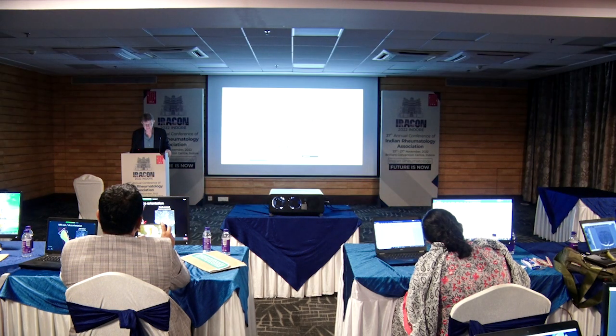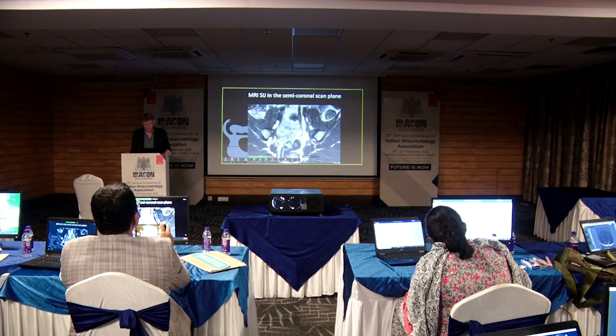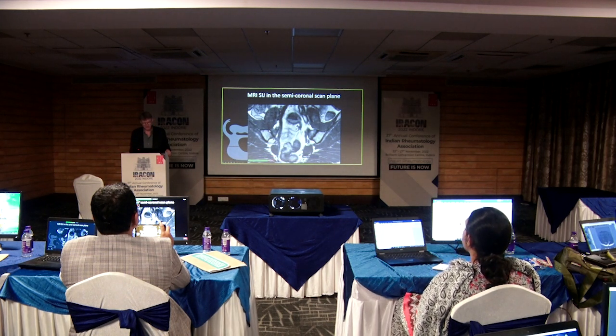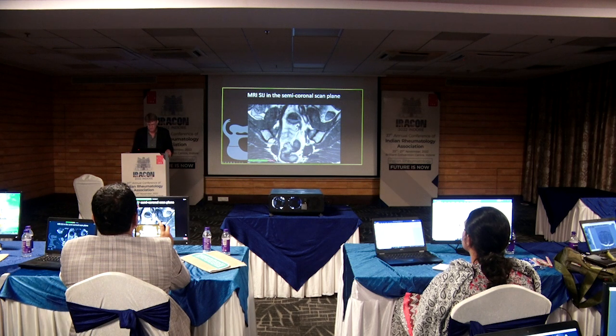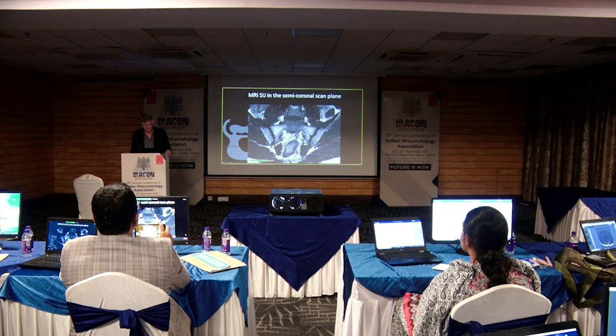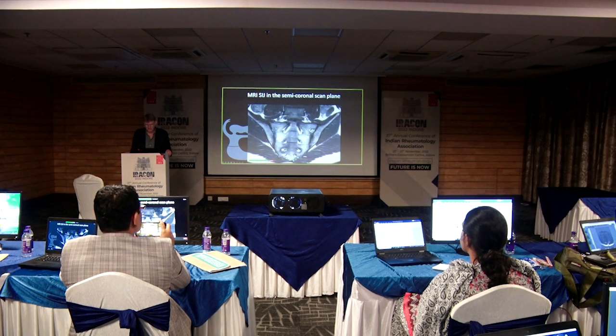And if we look at images obtained in that way, then it looks much nicer. You're in the anterior part, you have the ilium, you see it first, then the joint starts appearing here in the front. You can see that you are anterior because you are inside the pelvis and see pelvic content like the bowels. And as you move further back, the joint becomes higher and higher, as you can see. This is not a normal joint, but we'll come back to that later. And after some time, getting higher and higher, some things start to happen here and here. And this is not an erosion.